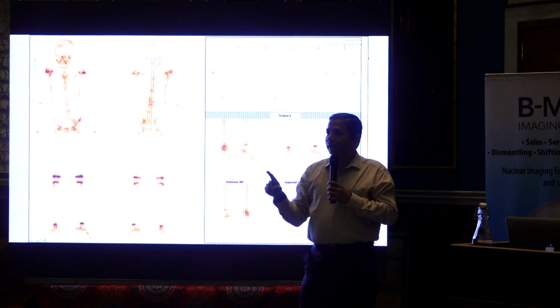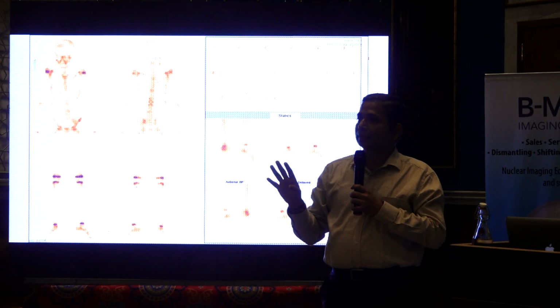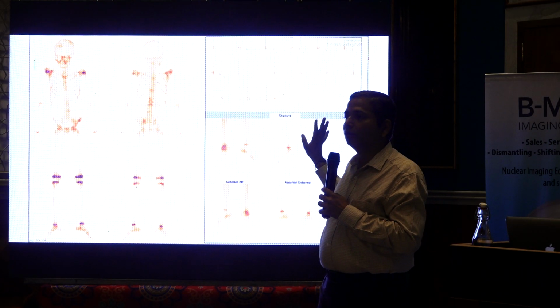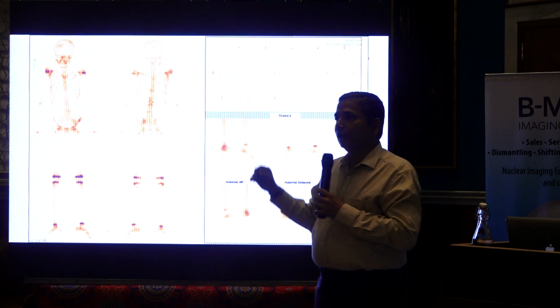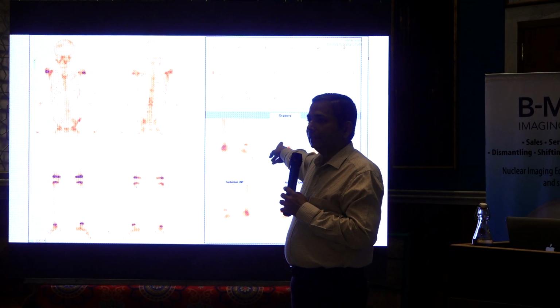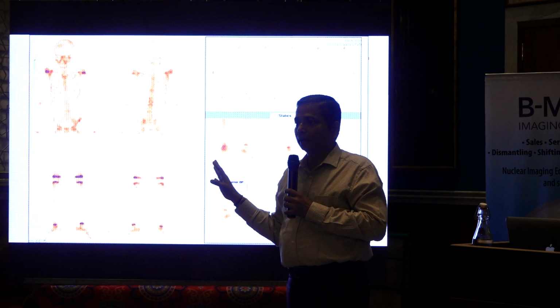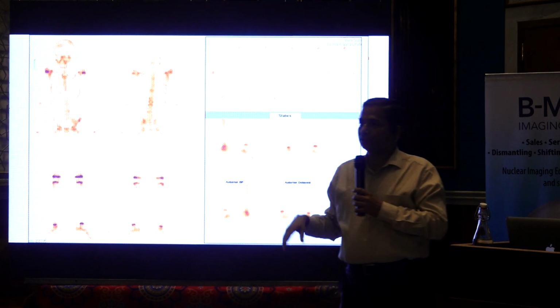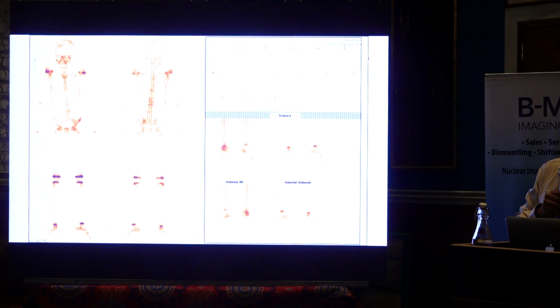So that indicates that bone is not involved. Whatever inflammation is there, it is there in the soft tissue only. So we can comfortably rule out that, at least in the ankle, the bone is not involved. Though in other places, the ribs and whatever we are seeing, that shows uptake. So anyways, the patient has skeletal pathology, but per se the ankle joint is not showing bone involvement. This is a case of multifocal vasculitis.